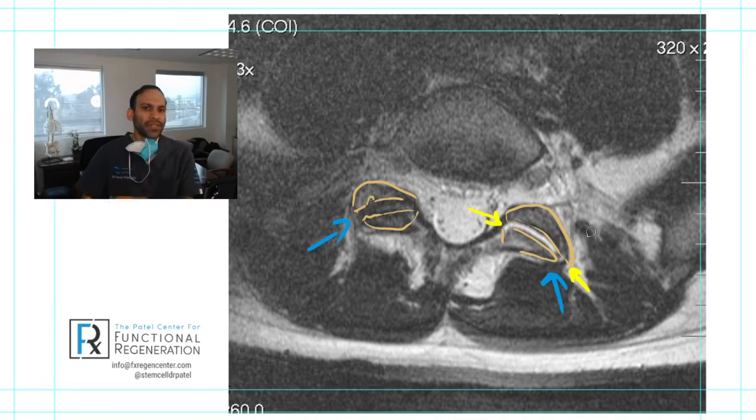If this patient came to me and said, "Doc, I have 0 back pain," then I'd say, all right, then this might be your normal. But if they said that they have back pain on their left side, and I did some physical exam maneuvers to show that there was anger or pain coming from the facet joints, and then I look at this MRI and I see that there's some inflammation inside the joint, well, that's telling me something, right? You gotta correlate what that is.